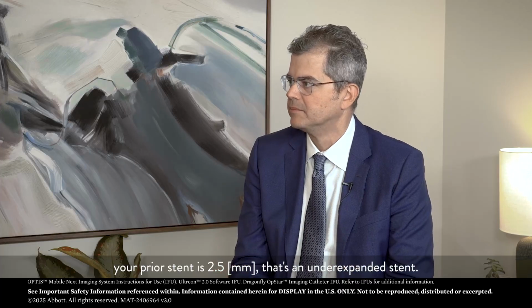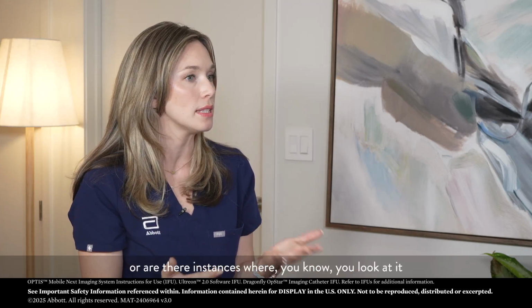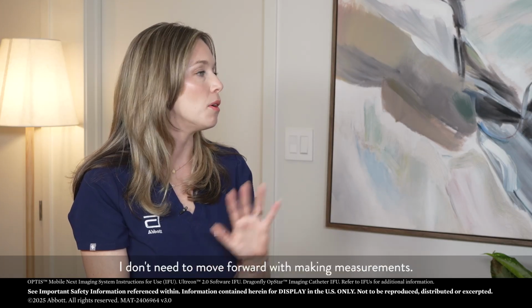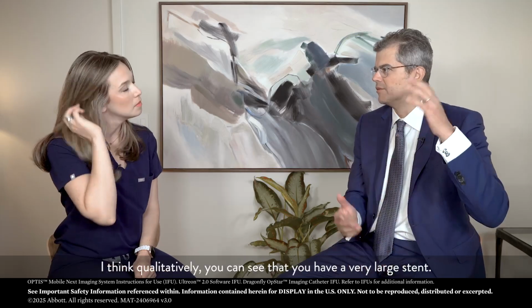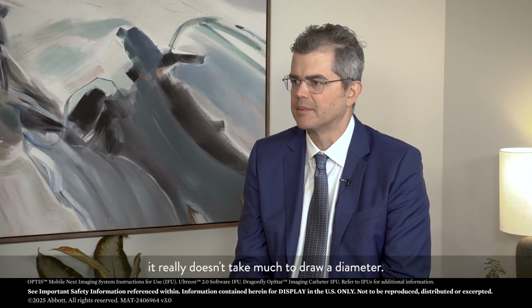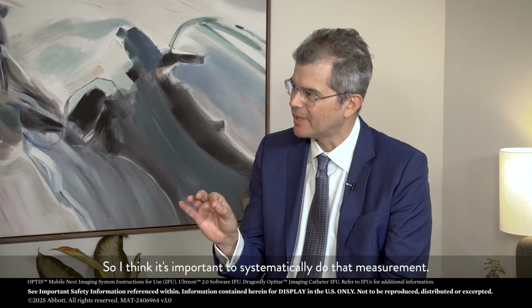that's an underexpanded stent. Now, when you have an ISR case as standard, are you always performing that measurement, or are there instances where you look at it and you say, no, this is definitely a biological failure, I don't need to move forward with making measurements? I think that's a fair statement. I think qualitatively you can see that you have a very large stent. I would still recommend, it really doesn't take much to draw a diameter, and your reference, you have it for free, your lumen reference. So I think it's important to systematically do that measurement.